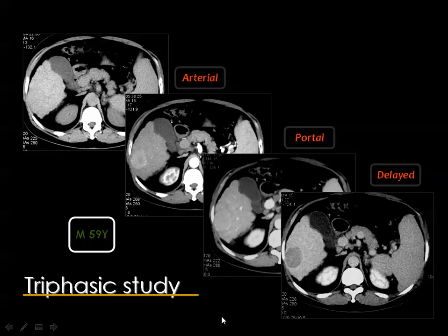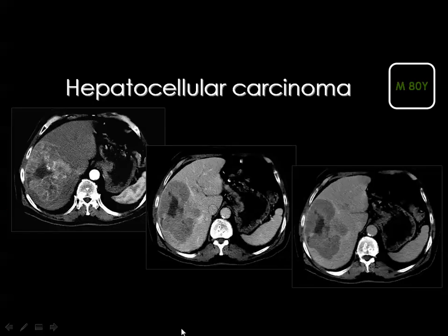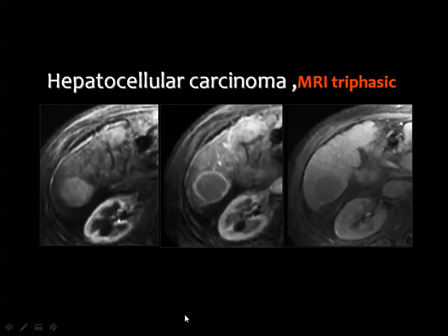and this, as I have mentioned, is an exception seen only in some of the cases, especially if the tumor is relatively hypovascular. Then this is the hepatocellular carcinoma before contrast injection and in the arterial phase, and you can see the heterogeneous enhancement, and you can see also the central areas of breakdown. This is the full series, arterial phase, portal phase, delayed phase of hepatocellular carcinoma.